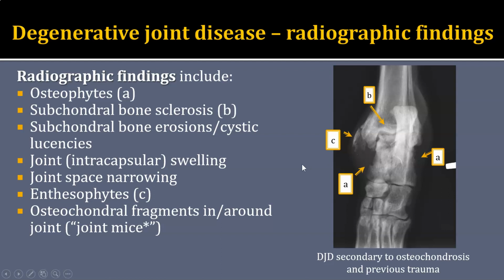As the articular cartilage becomes involved, it can get eroded, and so we can actually look like we have joint space narrowing. We do have to be careful about calling narrowing on radiographs, especially when the patient is not weight-bearing, because that can be an artifact of positioning.